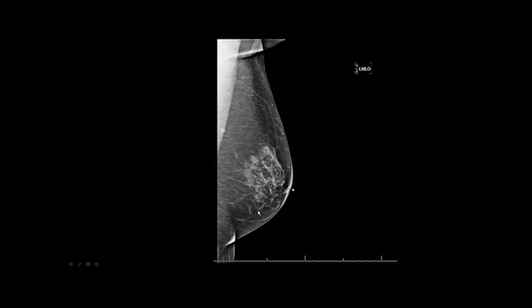Now here's another example. So you go to the center of the image. They are about 2 centimeters above the nipples, so they've centered it correctly. But once again, they put the arm in front of the detector instead of the back. You have an air gap here because of the fat of the arm, plus you have a crease here. The muscle isn't real wide superiorly. It does have a convex border, but they want to see more muscle than that.